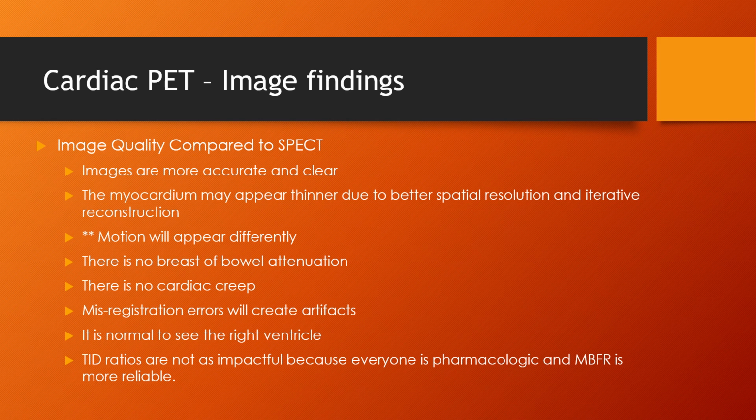And if physicians are not careful, then that can be mistaken for ischemia because a lot of times it will show up a lot thinner on the stress than it does on rest, but both of them will appear thinner. So it can easily be misconstrued by a reader who is not real comfortable or educated in apical thinning. But that is a normal thing that occurs with aging.